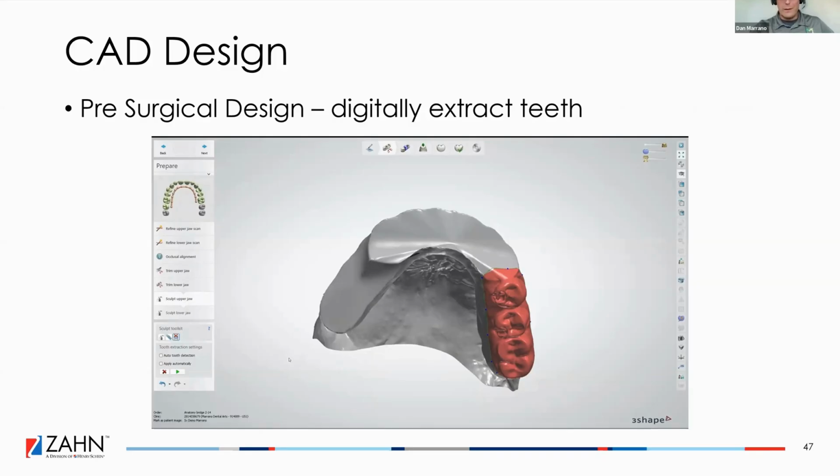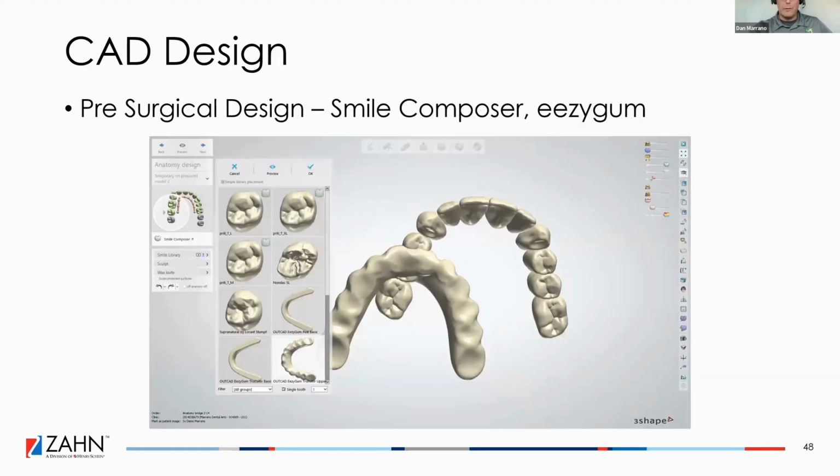We just digitally extract the teeth. Very much just chopping these right off. If I'm doing an FP1, maybe I'm just individually clicking each one and digitally extracting them. But for an FP3, I'm just taking huge chunks out. You can plane cut it if you want.